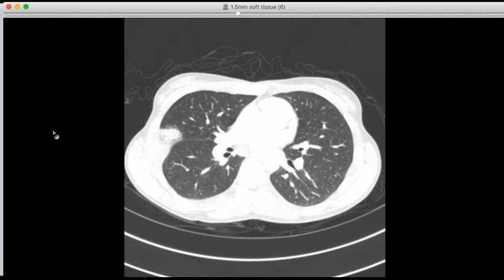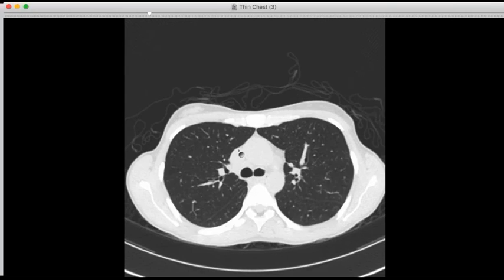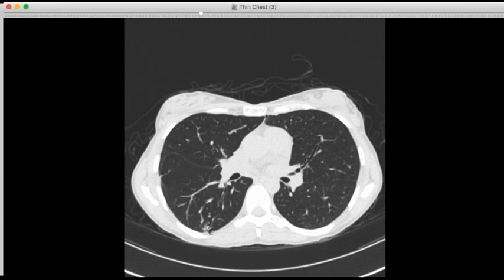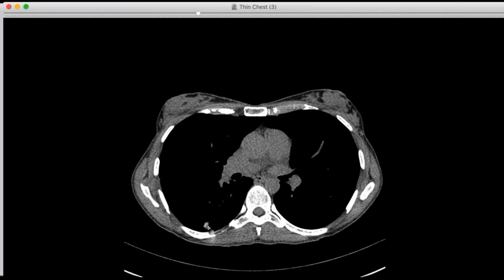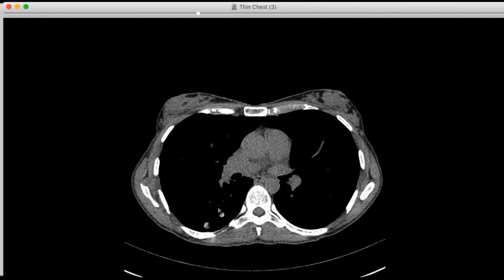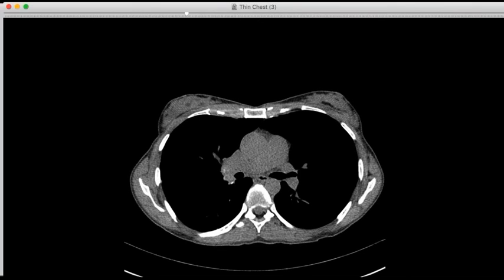So that was 2013. Here she is about 2 years later. And you will see that this upper lobe process has pretty much scarred down. There's a little bit of thickening around the vein there. But this lesion here in the right lower lobe, the nodule is still there, and those small satellites are still there. And you can see it's starting to get denser. So it's starting to develop some calcium. And we now see some subtle calcium in the hilar nodes here in the right hilum.